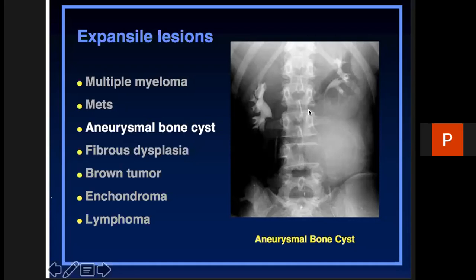Pedicles, doc. Yes, very good. Pedicle. So the pedicle connects the lamina to the body, the lumbar vertebral body. Very good. Okay. So this is an aneurysmal bone cyst.